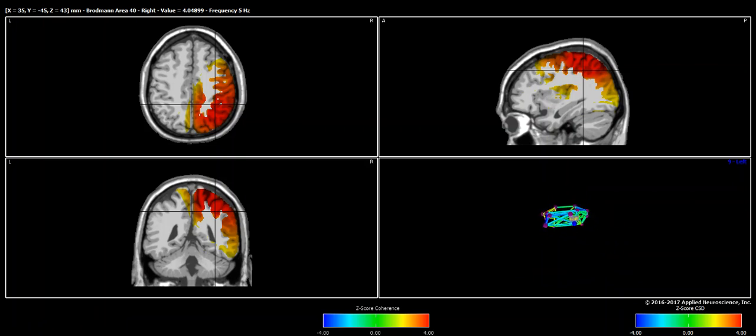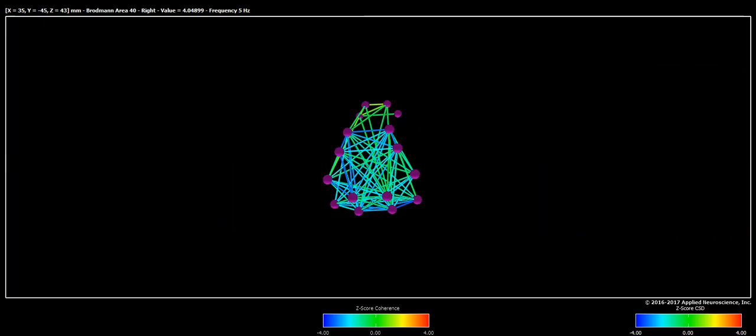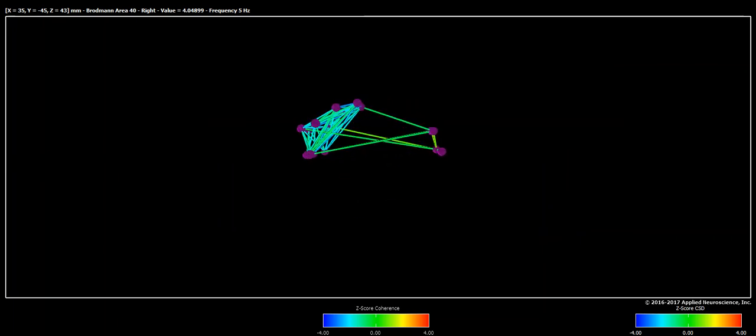This happens to be the attention network. I can look at, there's the default network, the executive network, etc. Now I'm going to examine this in the volume view. And I've set the thresholds in different ways. As I changed the thresholds, the color curves of z-scores are shown here.